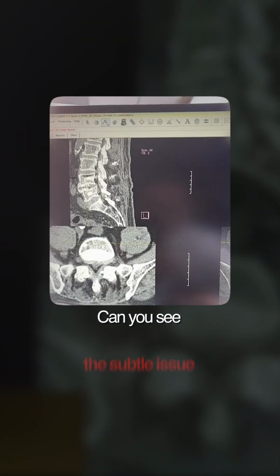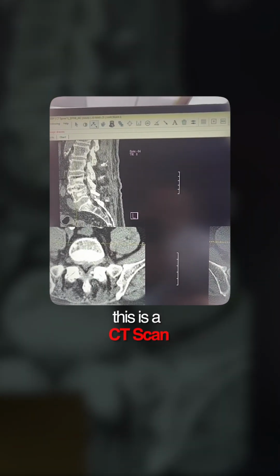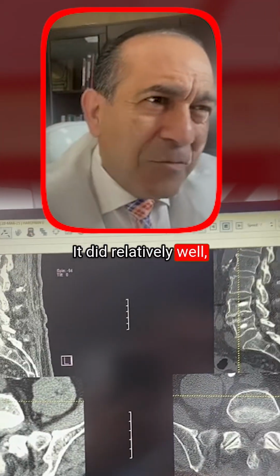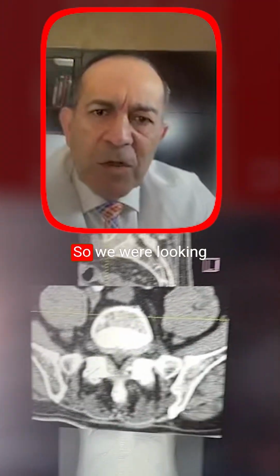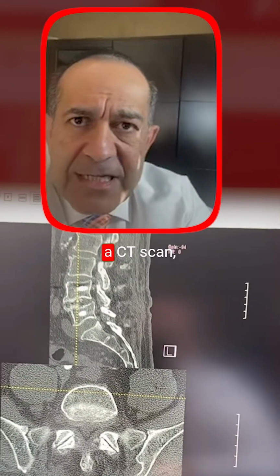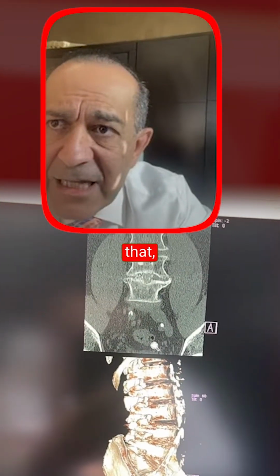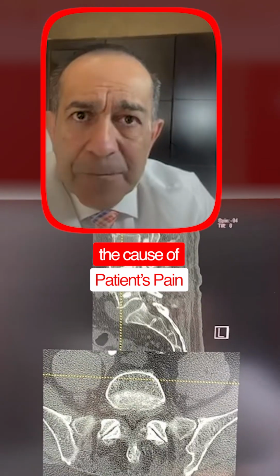Can you see the subtle issue on the CT scan? This is a CT scan of a patient who had lower back surgery a few years ago, did relatively well, and then slowly began having pain again. So we were looking for the cause of it, and we requested a CT scan, but unfortunately even the radiologist couldn't pick up the subtle abnormality that we were looking at and really was the cause of the patient's pain.